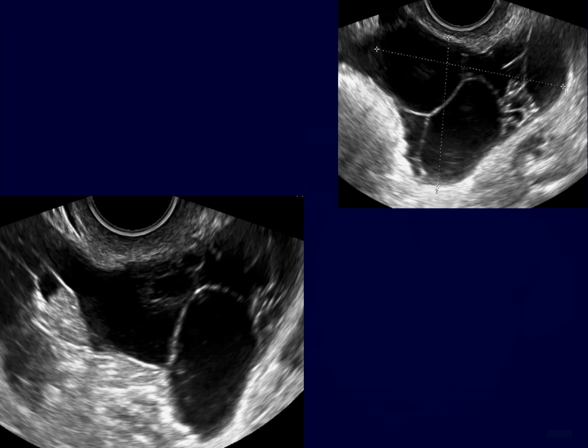Now here's a patient who also came in with pain, and you can see that the pelvis is filled with fluid, and the fluid is insinuating itself in the nooks and crannies of the pelvis. Doesn't seem to have a capsule, really. Does have some fine septations, but these look like adhesions. They look like very fine adhesions. Now you might wonder what this is here. This looks like a solid area.